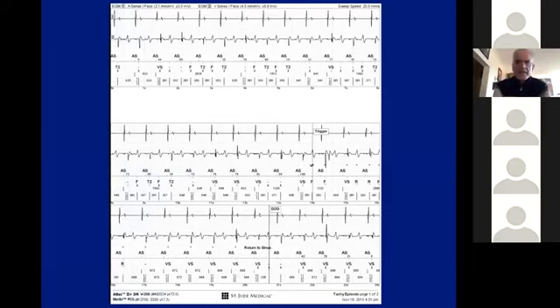Here is another example of noise or false detection. Let's see if we can figure it out together. This is a dual chamber electrogram. Again, atrium on top, ventricular next to it, markers, and then whatever the device is thinking. So the device is thinking ventricular sense here, and then there is another marker down below. X means no morphology match, and definitely no morphology match here. And then here there's a morphology match, and then another marker. And that marker corresponds to the T wave, right?